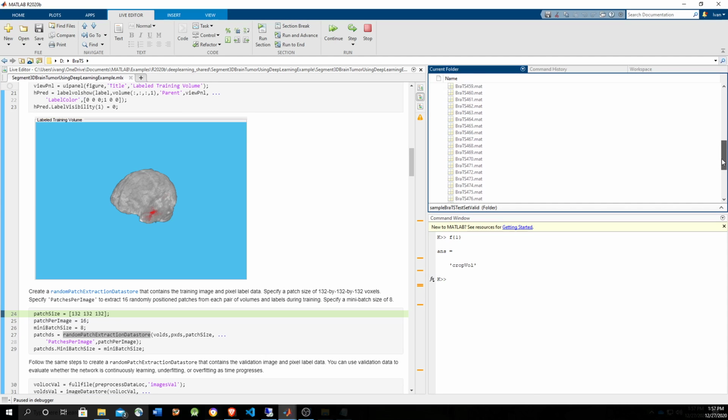So let's say in here we have like 30 images, and you take 100 patches out of that. Instead of having 30 data points, now you have 3,000 data points. So that's gonna give more power for the neural network training.